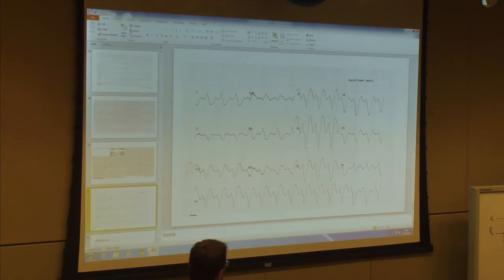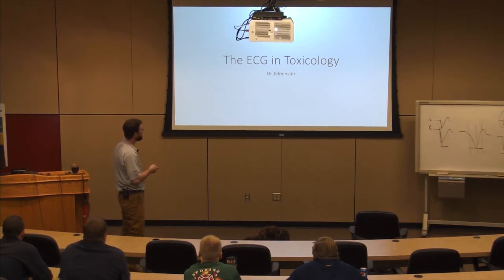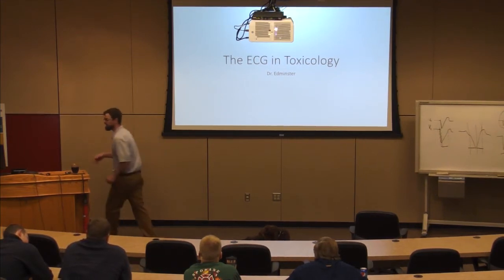Here's another one. Flecainide was on that list, right? Flecainide, an antiarrhythmic. Well, I got a bizarre wide complex rhythm that doesn't really fit anything, right? You're starting to see what bizarre looks like. Bizarre looks like something that doesn't fit nicely into a box and I can't package it somewhere. Well, now you've got a whole other compartment for things that look bizarre, called your sodium channels. And how am I going to put them there? With a prominent R wave in aVR, right?